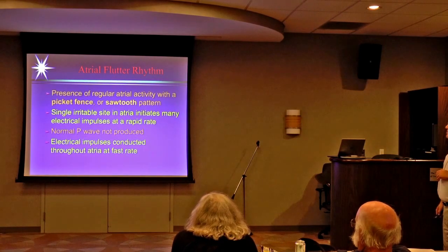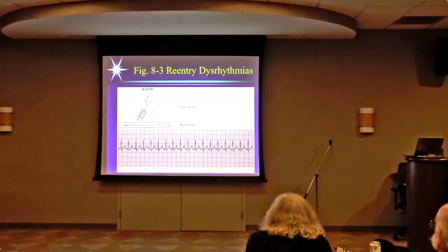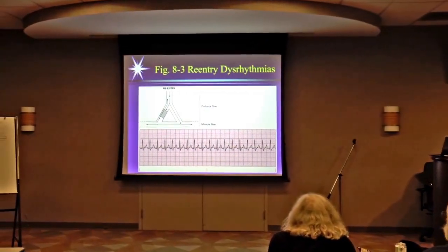So now we're going to talk about some of the rhythms. So we had the atrial tachycardia, okay, which would be this one over here.